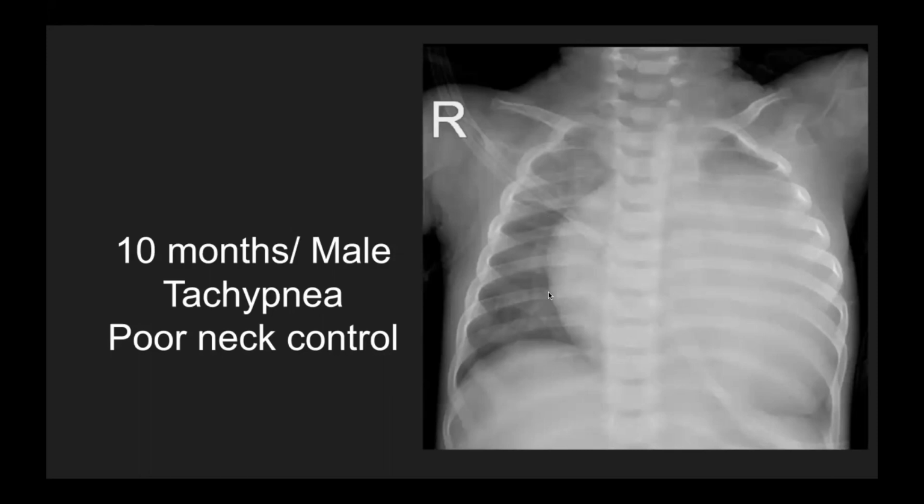And so the right lung is also visible. And why is it so much on the left side, unilateral? The other question is why there is not much mediastinal shift to the other side. The possibility might be that there is a big heart which might be compressing the bronchus, causing associated left lung collapse as well, which is not very well appreciated here.